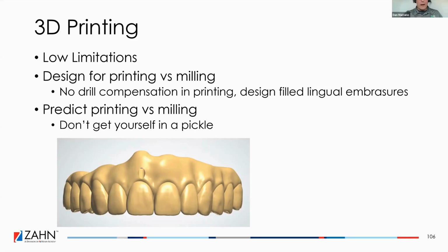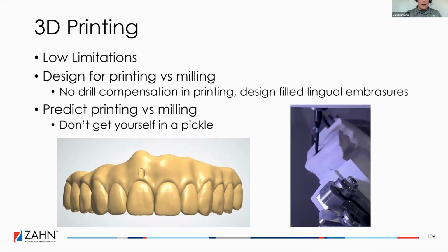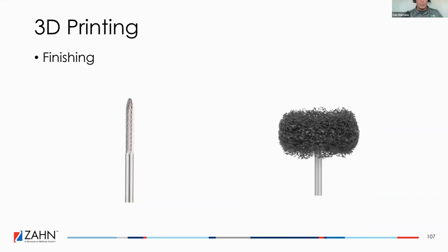I printed it. He said it was great. Go to final. And it took me a while to get this to mill. I eventually put this into 52 DCI with the full C clamp. And in hyperDENT, I was able to get this to mill like that. It was a struggle. It wasn't happy about doing it, but it did work out. So keep that in mind when you're designing some of these and maybe the manufacturing restrictions you might have when you go to zirconia.